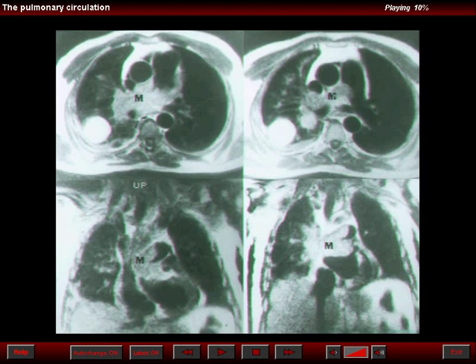Axial images, top row, and coronal images, bottom row, of this patient showed a mass in the right hilus and at the bifurcation of the right bronchus with an increased signal at the level of the cavity of the right lung.